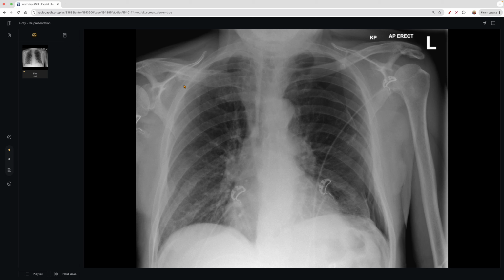So this patient probably had a right clavicular fracture and it's probably healed over, and that's why it's somewhat smooth and not a sharp angle like an acute fracture. So it's probably a healing fracture. A callus formation is what we call that. And then we go to the left, all fine.